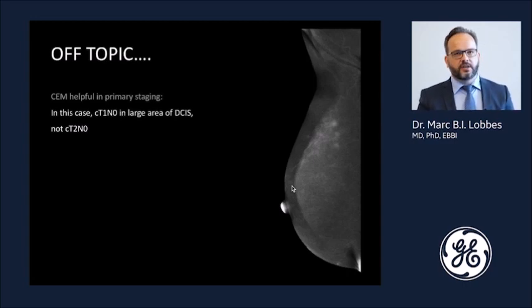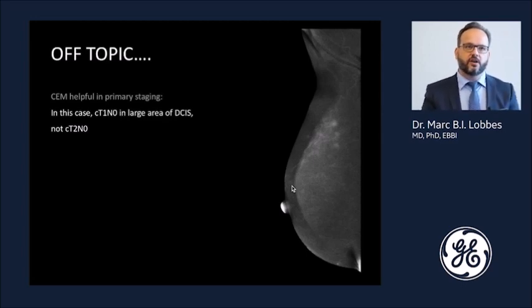And sometimes in tumor board meetings, we have this discussion, well, okay, doctor, is this a T2 staged tumor, or is this a T1 stage tumor? And with the help of these kinds of appearances on contrast-enhanced mammography, I think in this case you would recommend that your preference is a multifocal T1 invasive breast cancer in a large area of DCIS, and not stage 2 invasive breast cancer, which sometimes can have consequences for surgery, for neoadjuvant or adjuvant chemotherapy, or even oncoplastic surgery. So these kinds of examples can help you direct your colleagues into the appropriate treatment strategy.